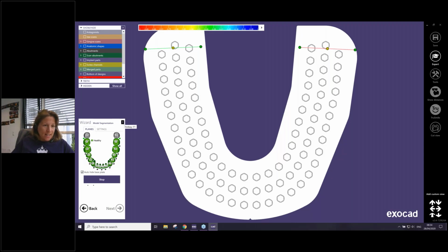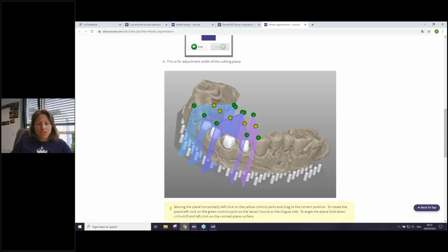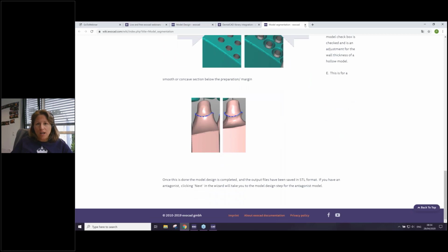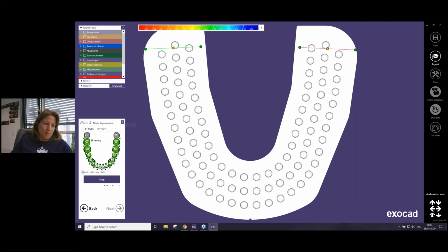So once again, here with the small symbol, you come directly to our wiki page. It's not totally updated, but here you can see the explanation of what is going on with the model when you change the values. You can read it here on the wiki, or you click here on the small symbol in the wizard step.